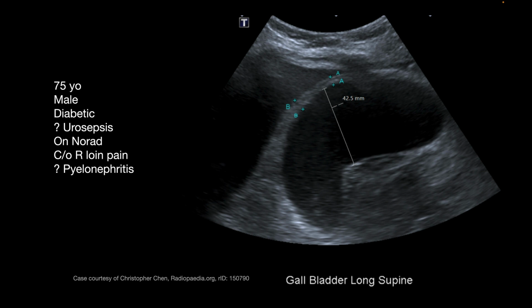And lastly, not always do we see stones in cholecystitis. So particularly in older patients who are vasculopaths or diabetic patients, they can present very unwell with this appearance. And this is a picture of acalculous cholecystitis, so a big distended gallbladder that is tender to push on and has a thickened wall and makes you think that this is cholecystitis, but you don't actually find a stone.